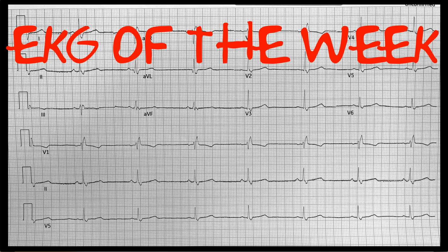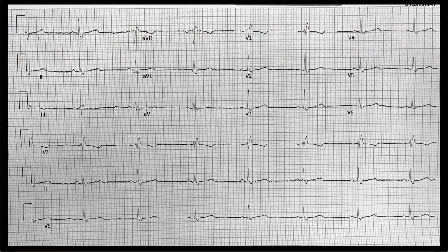We're going to go through another EKG and get a little practice on making sure that we hit all the fine points of it. And this is a pretty prototypical EKG for a couple of different things, so this should be hopefully a good one. Let's look at this EKG. Go ahead and pause the video, take a second.